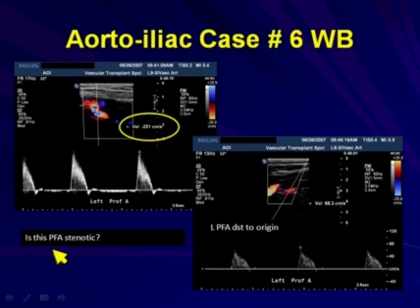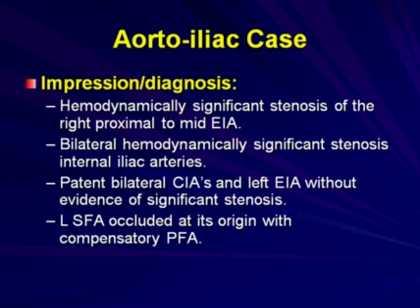And so the question is, is this PFA stenotic with this step up in velocity? Well, the answer to that question is there's no poststenotic turbulence here. And this PFA is simply compensatory for the occluded SFA, so it's not really stenotic.